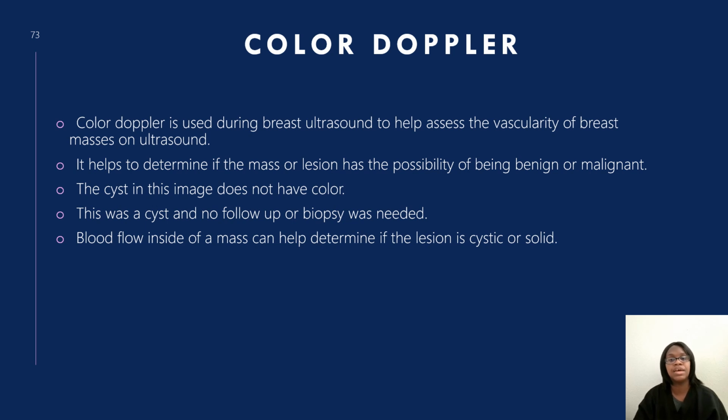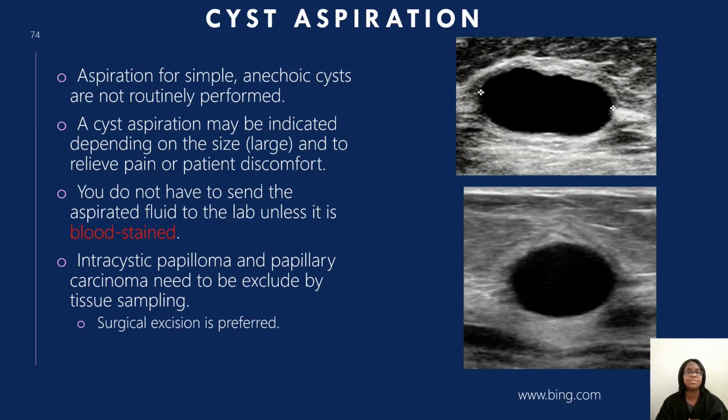Color Doppler, whenever a patient comes in for either a cyst or a lesion, us as ultrasound techs, we like to put color on the image so it will help determine if something is a cyst versus a solid tumor. So if a color is in that abnormality, then it could be like a solid tumor, and it can help rule out if it's a cyst versus a tumor. And then you have another image of a cyst right here.